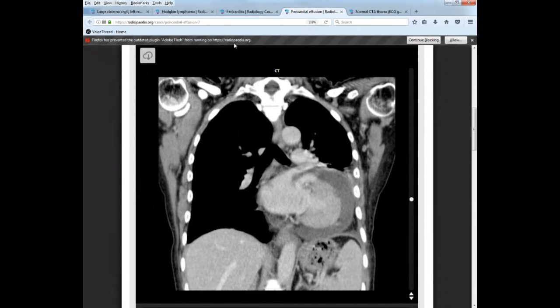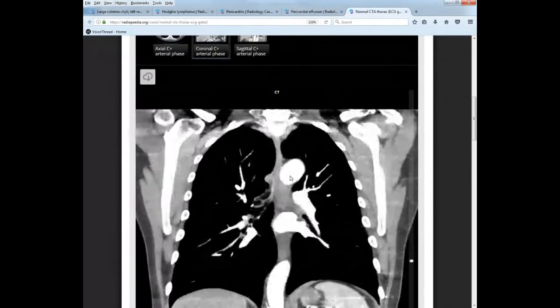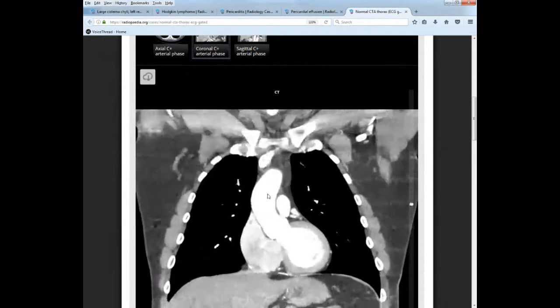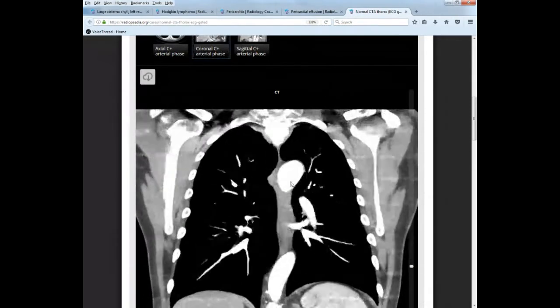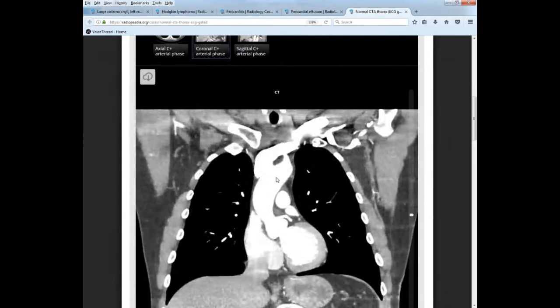The last thing we have to talk about is, we talked about the three sections of the aorta, ascending, arch, and descending. Now the branches. So let's talk about the branches. Let's go over to our CTA again. The main branches of the aorta. Okay, here's the aorta, left ventricle, root, and here's your ascending aorta. Here's your arch, and then here's your descending aorta traveling posteriorly behind the heart. So we have ascending aorta coming out.